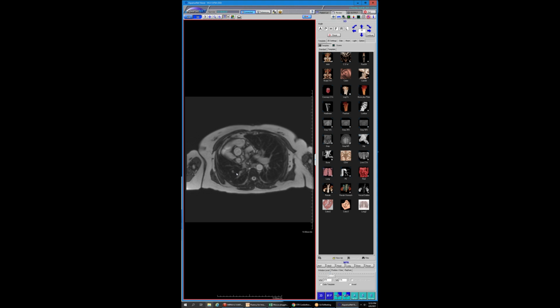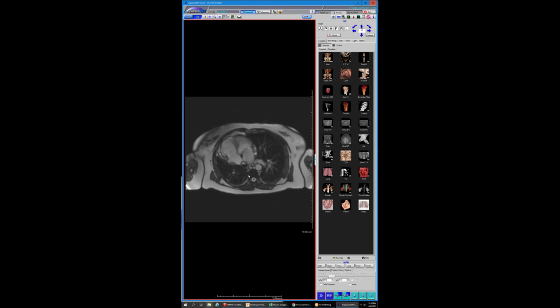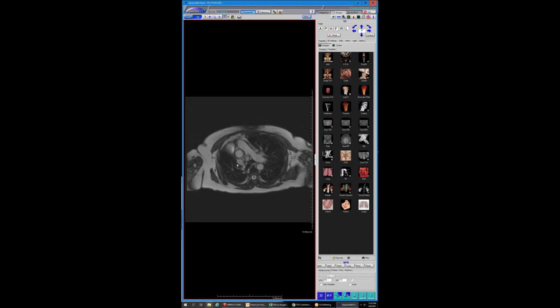And the recent cases I've seen in the asymptomatic older patients, that drainage was almost at the cruce where it was getting very narrowed. But you're right. I mean, this is not a normal lung, and it's by no means getting half of the blood flow. It's probably getting 10, 20% of the blood flow. But just an observation I had seen, and it was just a case I really wish I was paying more attention when I saw the localizers and before the patient got off the table.